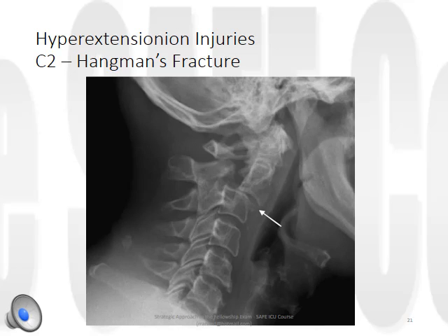An example of a hyperextension injury, the less common injury, is the C2 fracture, the hangman's fracture. This is a high force hyperextension injury. An example might be a passenger hitting the windscreen of the car with the forehead with no airbags. The fracture involves the pedicle, the pars interarticularis of C2. You can see that it's snapped away from the DENS and the body here.